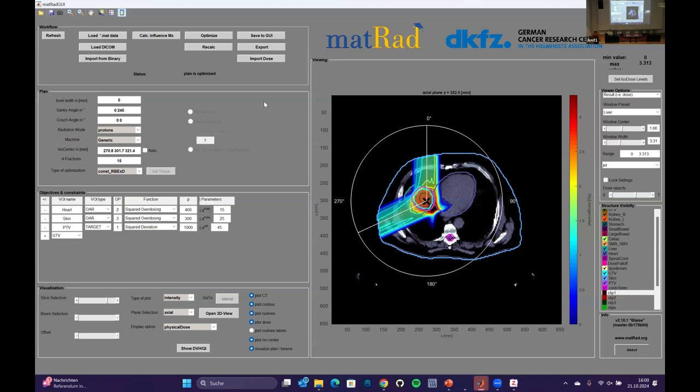And what you see here, maybe I can zoom a bit, is that we now have a horrible hotspot here where the Bragg peaks shift into each other. There were Bragg peaks here that suddenly saw lung instead of liver tissue. They now just shift into the first tissue that they observe.